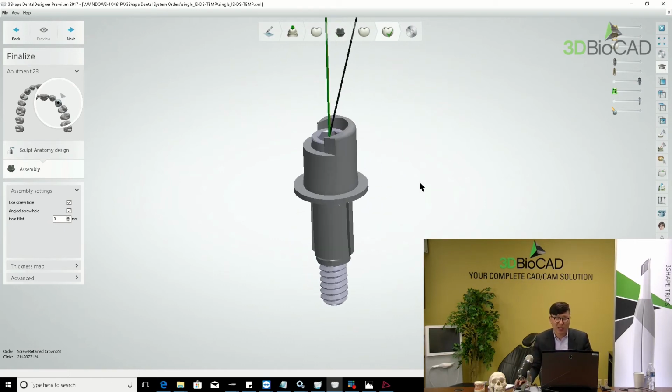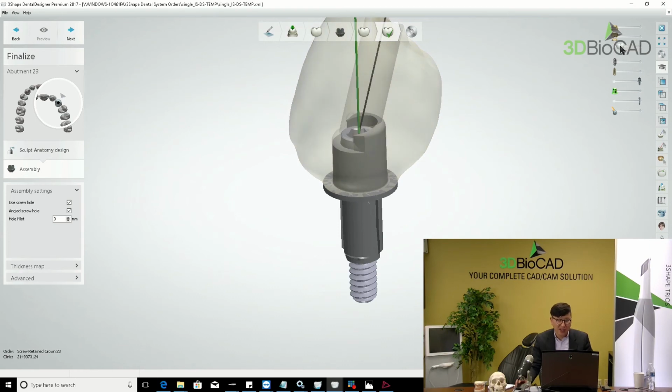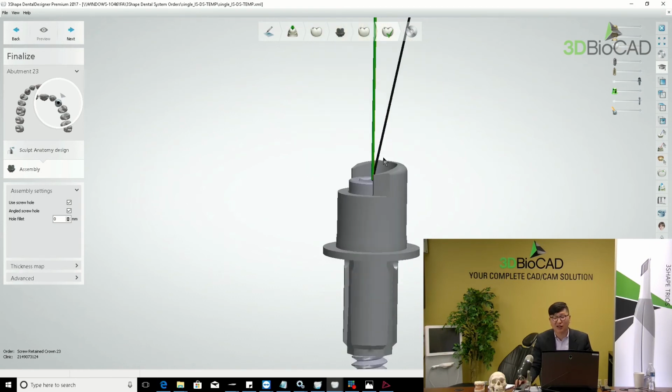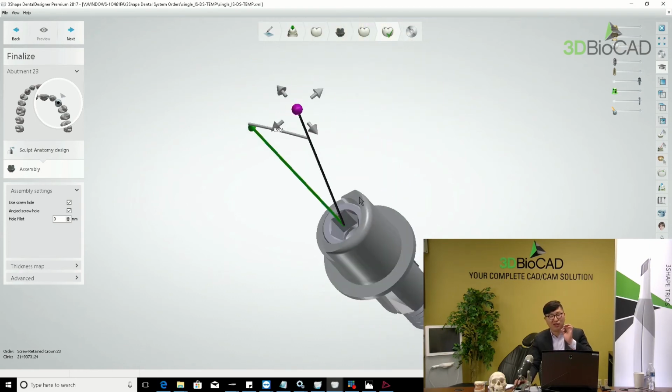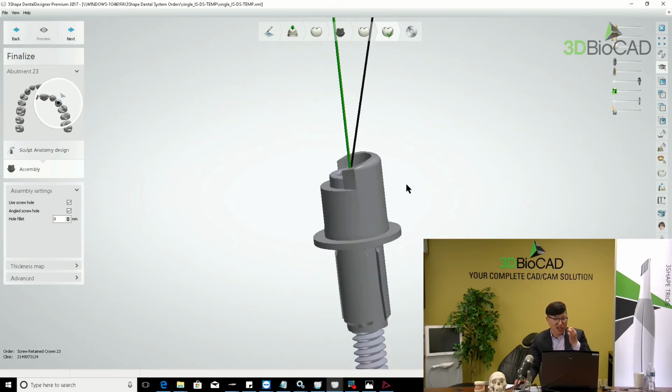So my point is, just do it like that, design it, and after milling, just cut out or grind out the anti-rotation marker or anti-rotation notch on the titanium base, and then make your crown able to rotate all around on the titanium base.